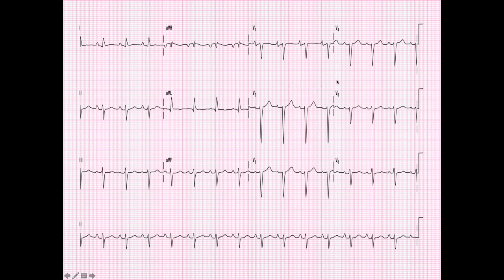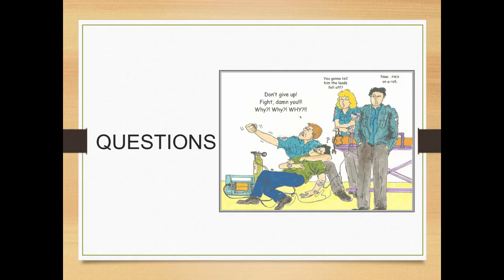So intra-atrial conduction delay. And if you want to really get into it, even though we don't see P pulmonale here, that first half of the biphasic P wave, that positive half, is a little bit larger than the second half, so we're going to call it an intra-atrial conduction delay, but we are kind of leaning towards you probably maybe have right atrial enlargement.